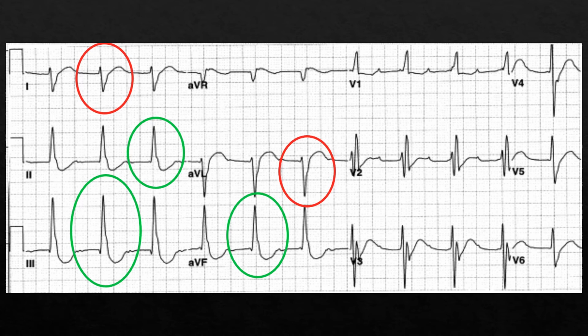You can see the green represents the QR wave. The Q wave is barely visible in lead 2, but you can see just a little bit. But there is a QR wave pattern with an RS pattern in 1 and AVL. And you can see over in the precordials that we also have a right bundle branch block occurring as well, which I'll talk about in a minute.